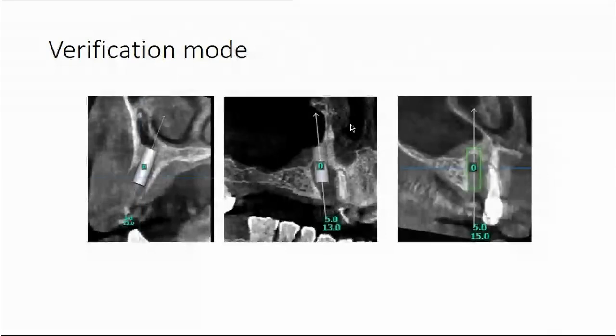If we could see in the middle picture, maybe because of the interference with the maxillary sinus, we will have to change the surgical technique. Maybe we will have to change the implant dimension. Maybe in this situation, when we look at the neighboring tooth which has a periapical issue, we will need to quit the procedure, or we will change at the end some prosthetic elements which will enable us to do the prosthetic reconstruction.